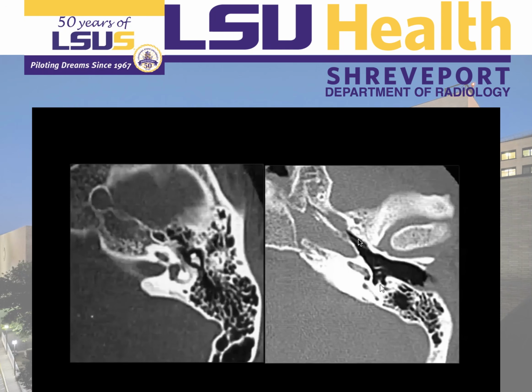This is where you also see this animal here, that is the sea lion. You always have to look for its paws. This is the eminence that is important for you to remember, because this is the pyramidal eminence. It looks like a pyramid, right? In the medial portion, this is called sinus tympani. The lateral portion is the facial recess, where the facial nerve passes on its way to the stylomastoid foramen.